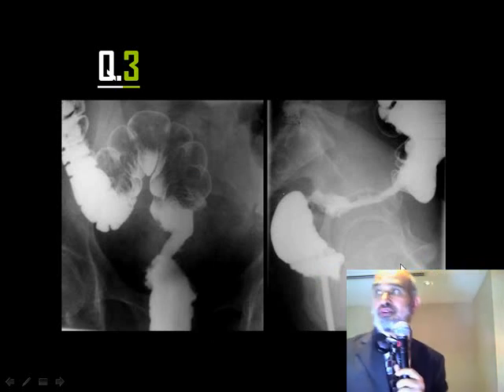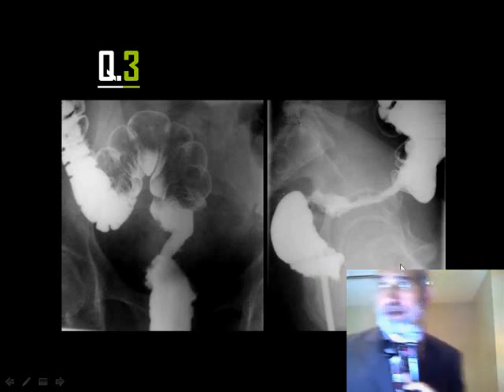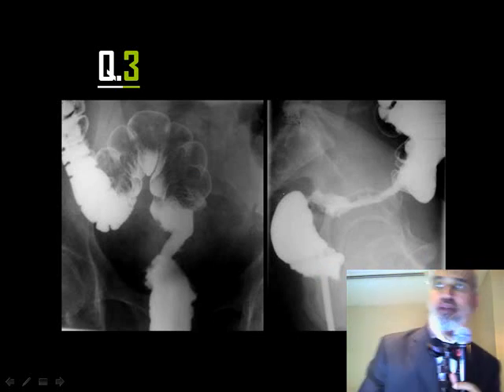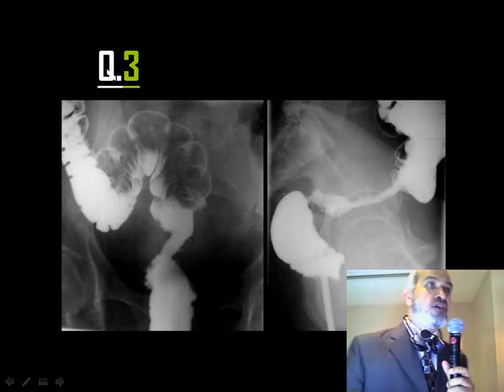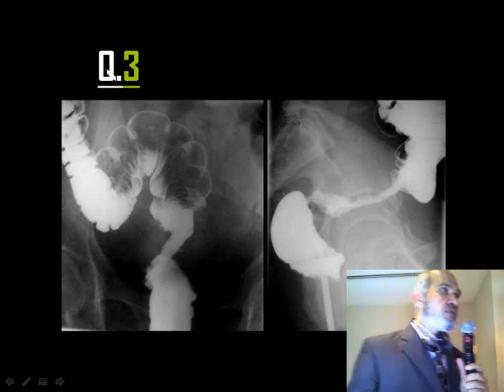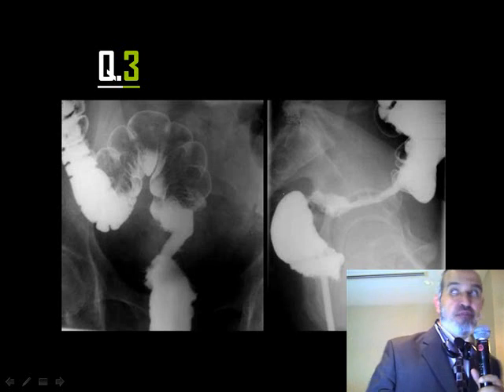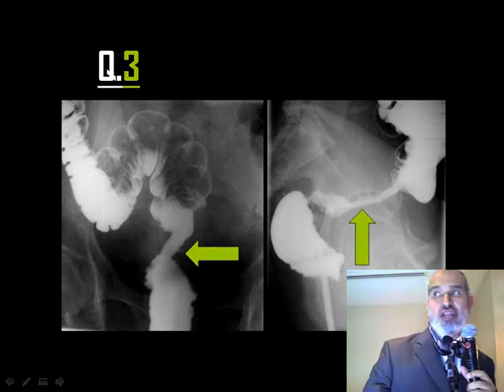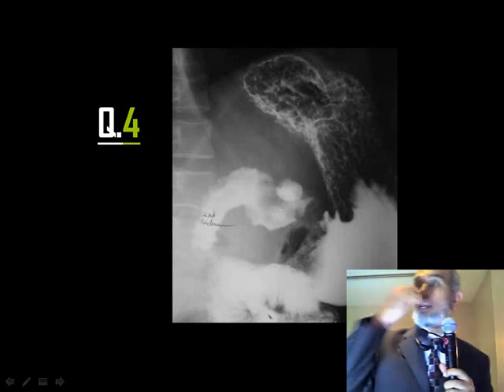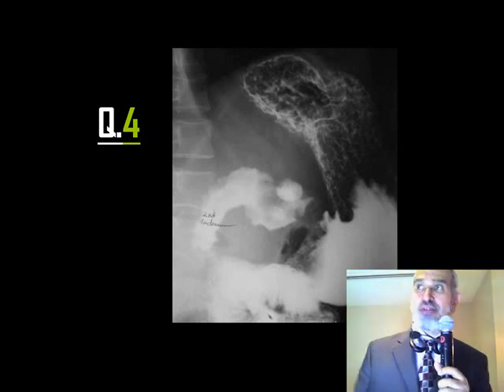Okay, which part? Colon, rectum particularly. You see the nozzle of the barium enema. Then what is the diagnosis? A stricture, and what's the possibility? Malignant. Yes, malignant is the first possibility of any stricture in the colon until proved otherwise. What is the organ? A stomach. What is the lesion?